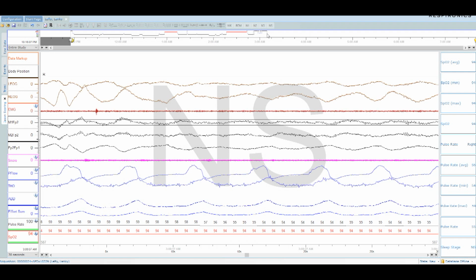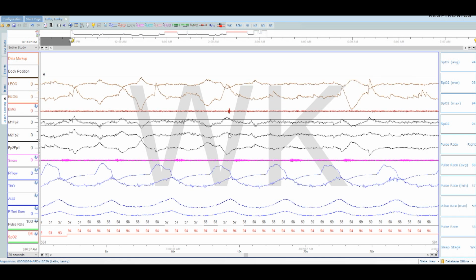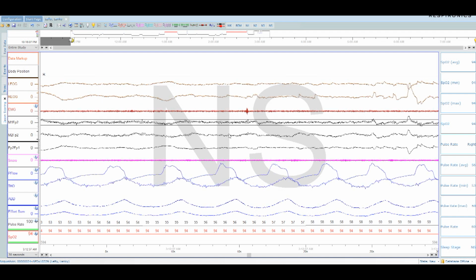I'm gonna try to hit that exact page. I missed it. Do you see that? I mean, you can see the EEG, but yet it's low. The frequency isn't quite as slow because this is wake. So having a human eye is, to me, super, super important. Anyway, we're gonna move along.